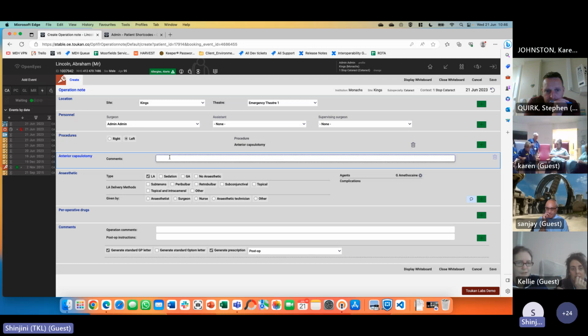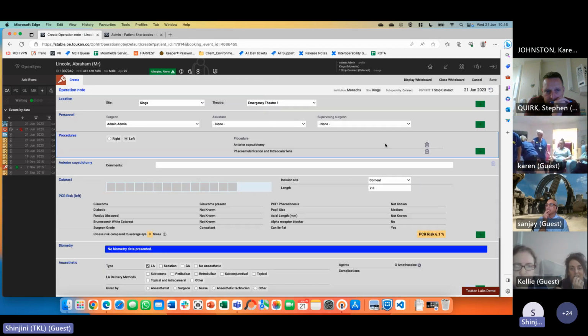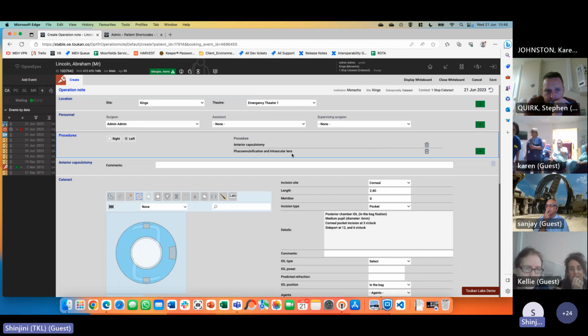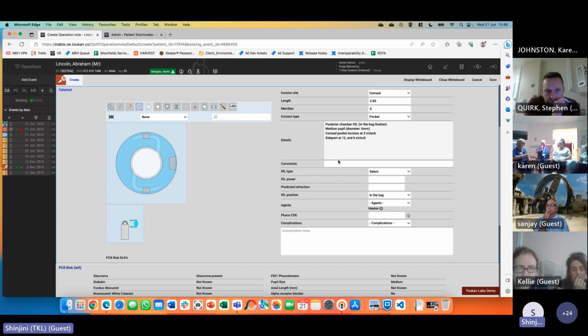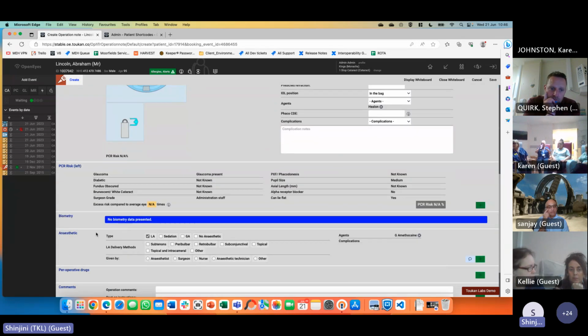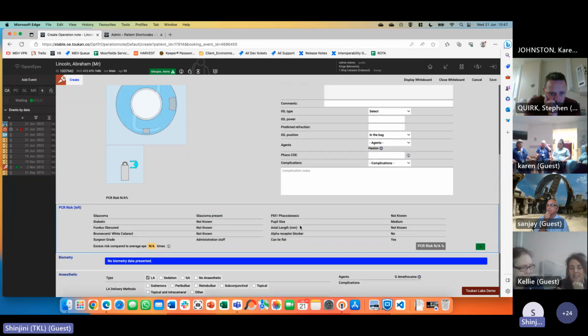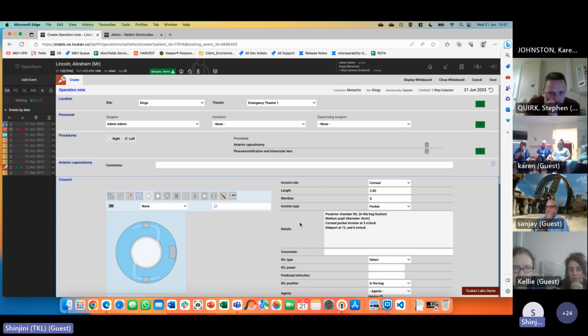Some procedures have eye draws associated with them. So if I select FACO IOL, a whole extra section of cataract PCRs will come up, but that's only for some procedures. If the biometry has been recorded and pulled in, that's where it would come up. So all this you will see when you get the system hands-on to play with.